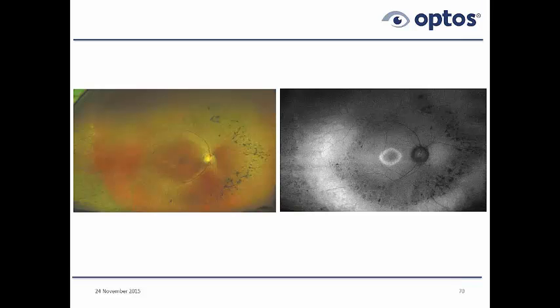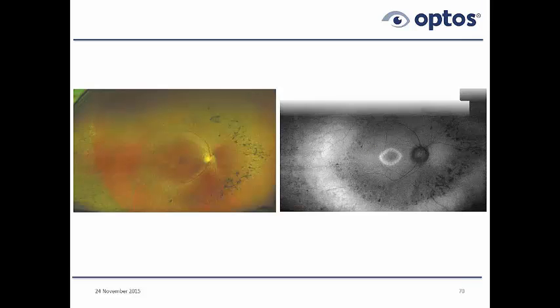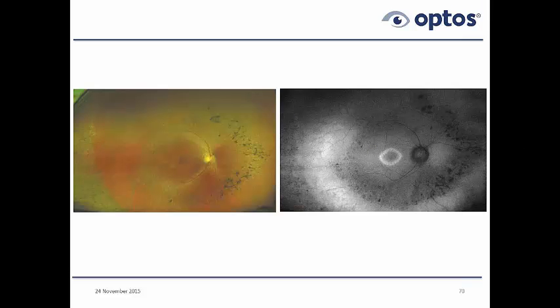Here's the right eye, here's the left eye with the fluoro. And notice in this one, at least at this magnification, we get that sense of the small ring, which is problematic the smaller it gets closer to the fovea, and this mid-peripheral ring over here, as we can see.